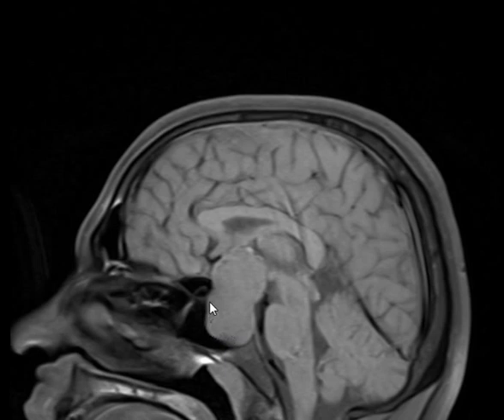They will match because the line is very clearly defined. So it's not ill-defined, it's well-defined, because when you say ill-defined, you are talking of either infection or malignant, most likely. When you say well-defined, we are talking mostly about something benign, right?